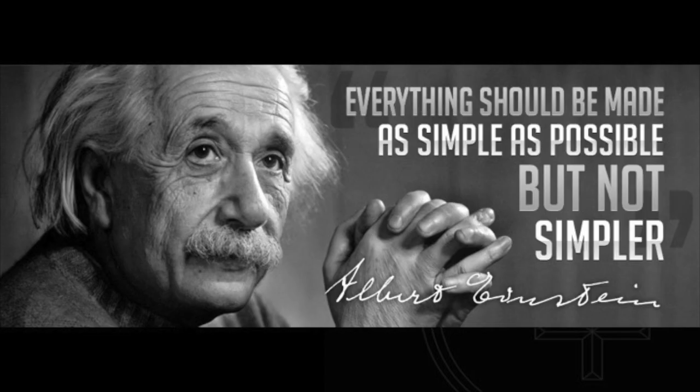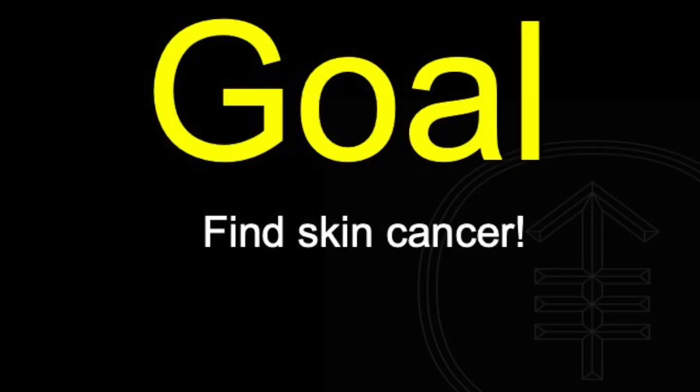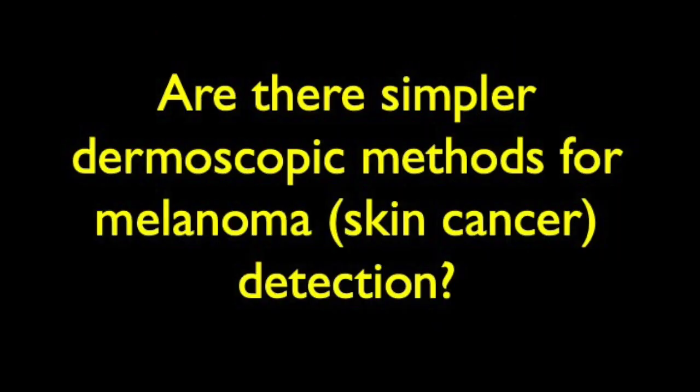Now, what can you take home if you said, listen, I want to start using dermoscopy today, okay? So how can I simplify it where my goal is just to find cancer, but I don't really want to make a precise diagnosis. I don't care if it's a basal cell, squamous cell, or melanoma. I just want to know, should I biopsy the lesion or not, with a reasonable specificity. I don't mean cutting off everything. So with a reasonable specificity.